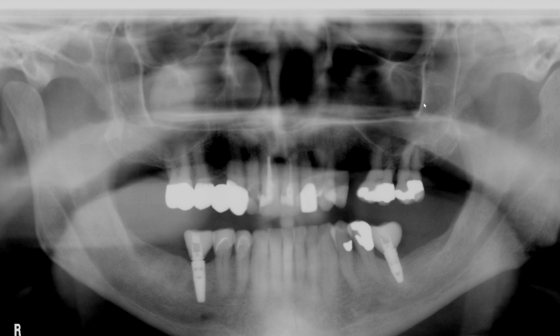And that's partly because there's a rotation of the patient's head in the imaging, and it could also be due to the fact that the size of the turbinates is not always symmetric. So this could be larger, hence may appear better, and this turbinate could be smaller and hence not as discernible on the panoramic radiograph. And additionally, we had to recognize a couple other anatomic landmarks.